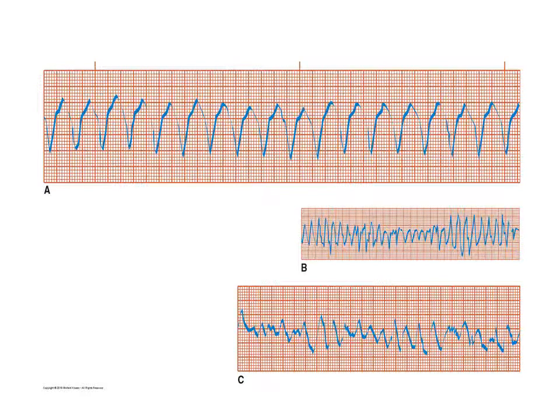In this picture there are different strips, all of them are ventricular tachycardia. The VTAC could be classified into pulse VTAC and pulseless VTAC. If I want to ask you if this is a pulse VTAC or pulseless VTAC, just think for seconds.